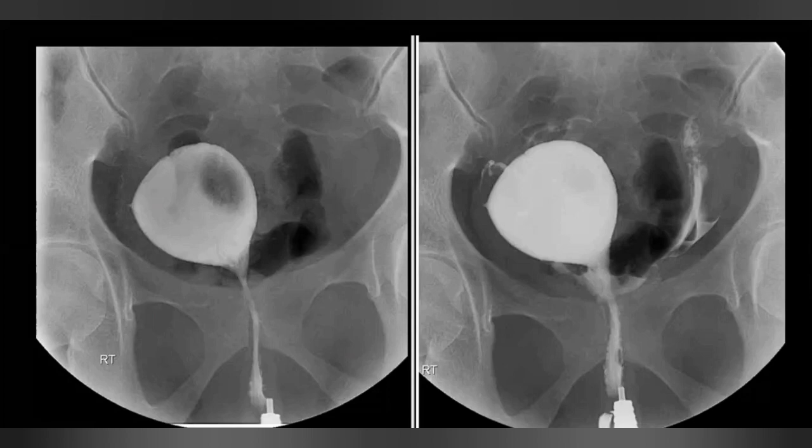It may distort the shape of the endometrial cavity as well, but it will be somewhat smooth as compared to any lesion or adhesions or synechiae. This enlargement and distortion of the shape will be smooth if it is due to fibroids.